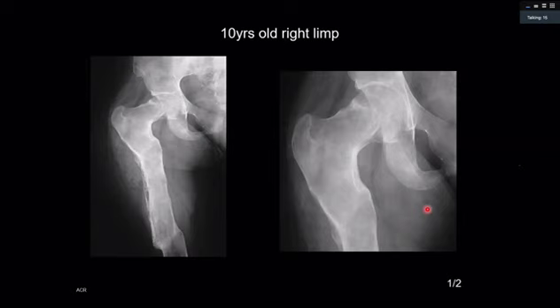There's evidence of probably previous fracture, most notably at approximately the junction of the proximal third and distal two-thirds of the diaphysis. And I think the visualized pelvis also looks abnormal. Therefore, I suspect that the skeletal dysplasia that is demonstrated here is polyostotic.